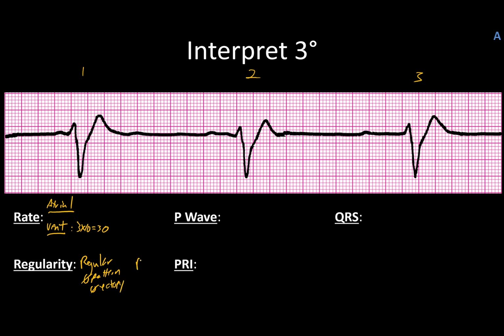We have P waves greater than QRS, which we have to prove. In terms of measuring between the R to R, from this one here all the way to this R wave way out here is 50. Pretty rare, but those two worked out together.